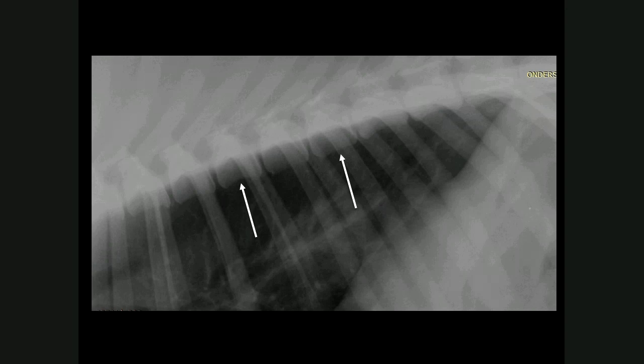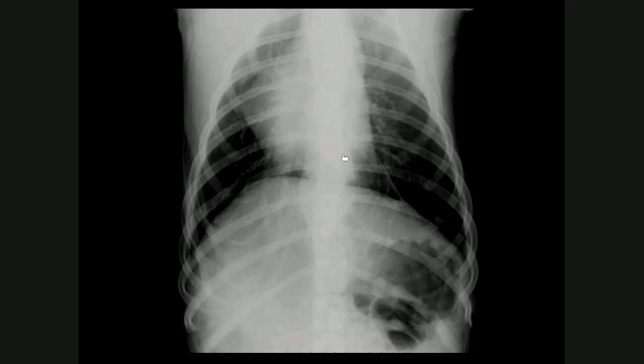And here's just a radiograph demonstrating the findings in spondylitis. The first arrow depicts a normal concave ventral vertebral body, whereas the second arrow will show flattening of that if you compare it to the ones more cranially. So there's 1, 2 mainly affected vertebral bodies, and this was as a result of Spirocerca lupi. If we look at the orthogonal DV view of the thorax, there's this large soft tissue opacity in the region of the caudodorsal mediastinum, and that's typical for Spirocerca to occur.